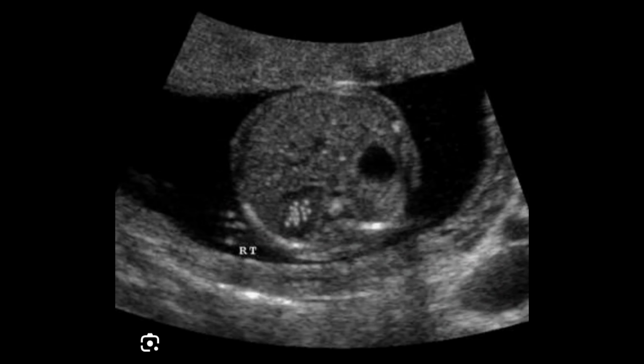You can see this neuroblastoma in the developing fetus. Here you can see this is the antenatal scan, and within the fetal area you can see the kidney, and the kidney is developing a lesion that is actually neuroblastoma, and neuroblastoma is able to metastasize to the placenta as well. So this is one of the hallmarks of the neuroblastoma, and this is a tumor which is particularly seen in the pediatric age group.